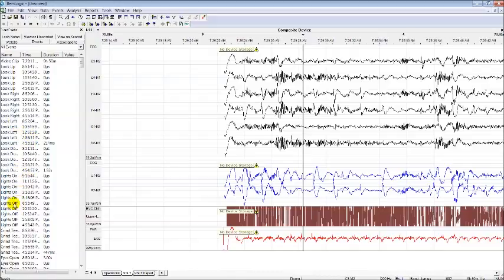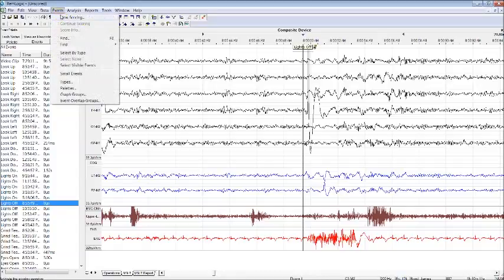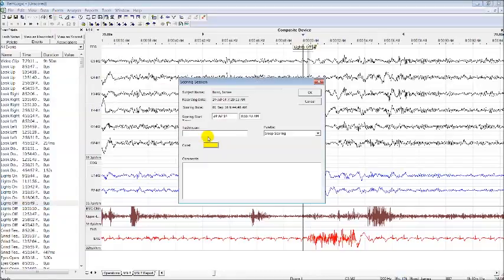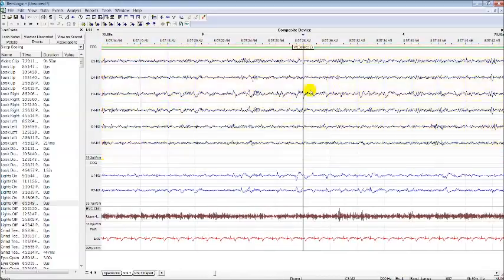So I can go to the first lights off, to score nap 1. Now I will go to event, new scoring. Just remember that each nap has to be a new scoring. So let's say I'll put here James 1. Then I will start to score.